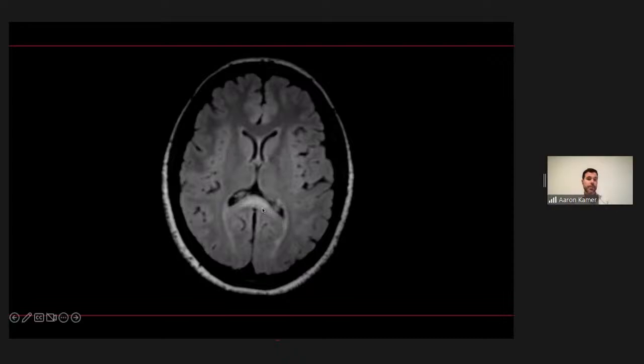So this is a good example of something that's referred to as a transient splenial lesion. I think Radiopaedia has it listed as a cytotoxic lesion of the corpus callosum, CLOCC, clock. It's fairly common to see this in patients who were on seizure medications, but for whatever reason have stopped them and started having seizures. It's kind of strange, but we will see this lesion in the splenium of the corpus callosum as a result of stopping those seizure medications.